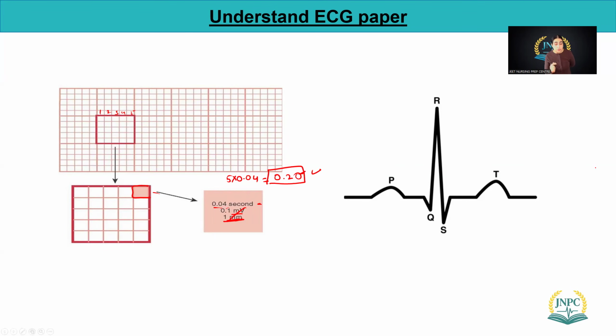We do not use what we call a trailing zero. We do not use trailing zeros. So it could be 0.20 second, but I would say 0.2 second. So one large box contributes 0.2 second. Not even 1 second. It's a very small fraction of 1 second, 0.2 second.